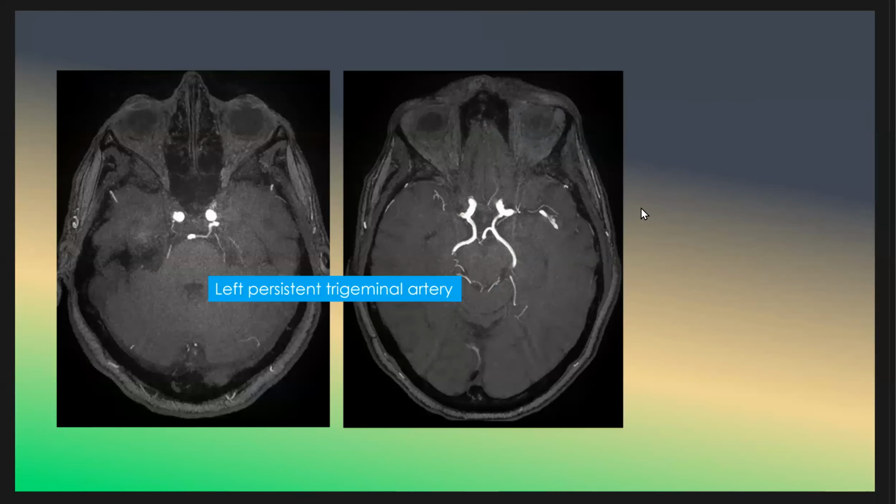We have venous angioma in the left frontal lobe with a prominent cortical vein and small collateral veins toward the frontal. This is a venous angioma. What do you think the patient has here?